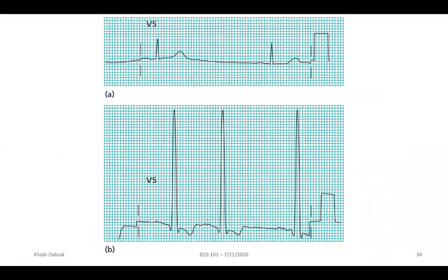So these are important things to keep in mind when you're making your calculations, and when we're getting to understand how we get the heart rate from the ECG. These are important things to remember.